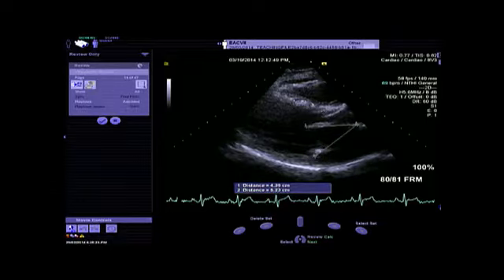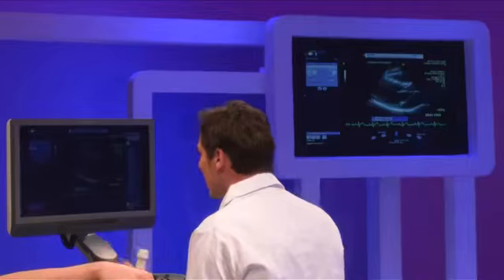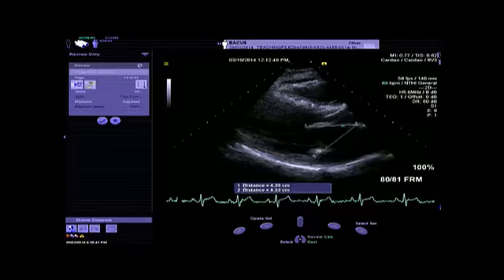and if you have the ratio of 52 above 43, you have almost 1.2, 1.3, and the cutoff to define severe dilatation of the mitral annulus is 1.3. So here we have another sign that is in favor of a failure of mitral valve repair: a severe enlargement of the left atrium, bigger than 50 millimeter, with a central jet plus more than 3 scallops involved in the process. These are all signs in favor of a failure of the mitral valve repair.